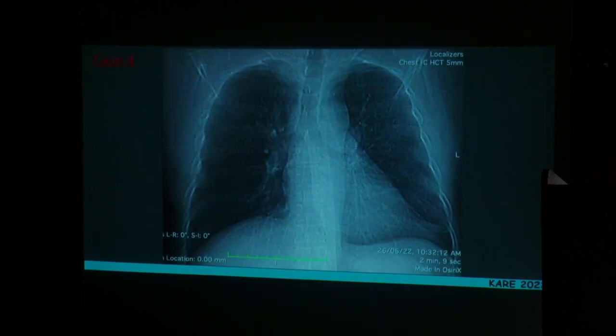Next, this is a scanogram. I could not get the X-ray and it was not that evident in the X-ray also. Any idea? Last row, could you make any findings? Concentrate on the upper lobes on both sides. RB-ILD will not be that evident in X-ray at all. Even in HRCT we will find it difficult to differentiate infection and RB-ILD.